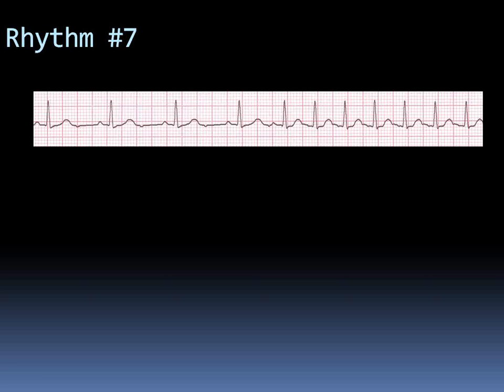This patient is probably getting premature ventricular contractions. So what you see over here is basically a very regular fast supraventricular tachycardia. It's called an SVT. And the reason we say it is an SVT and not VT is because the QRS morphology is the same as it was in sinus rhythm. See how it's a narrow QRS and there's sinus rhythm over here? The QRS morphology is the same. It's the same QRS, but you don't see any P waves now. Okay? So this is called an SVT, or supraventricular tachycardia.